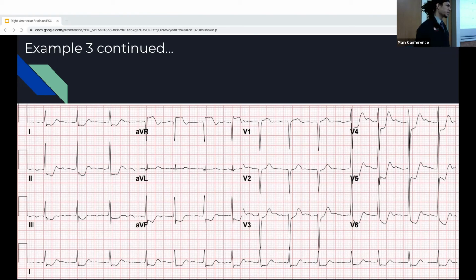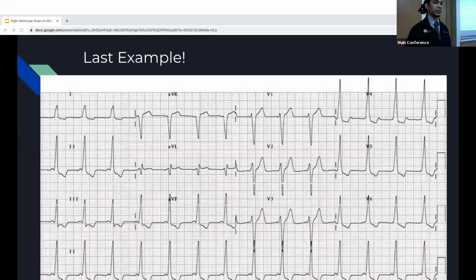So even though this patient came in with foot pain, you maybe think this is DVT and PE together. If you have persistent reciprocal changes elsewhere, have a high suspicion for a STEMI with the ST elevation in AVR.